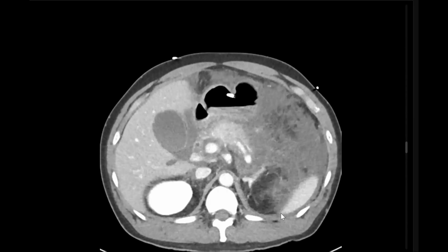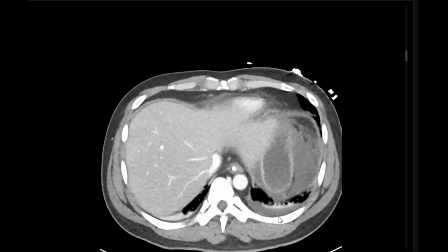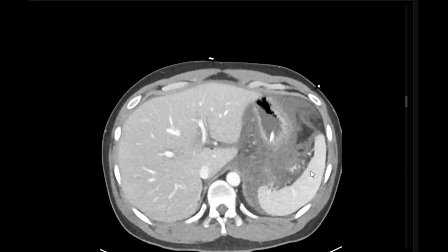I would look for whether the patient is having ascites or pleural effusion. The additional 2 points have to be given for that. So this makes the total CT score 10. So this is a poor prognosis, and this patient needs urgent surgical referral. Correlate with the lipase and amylase levels.